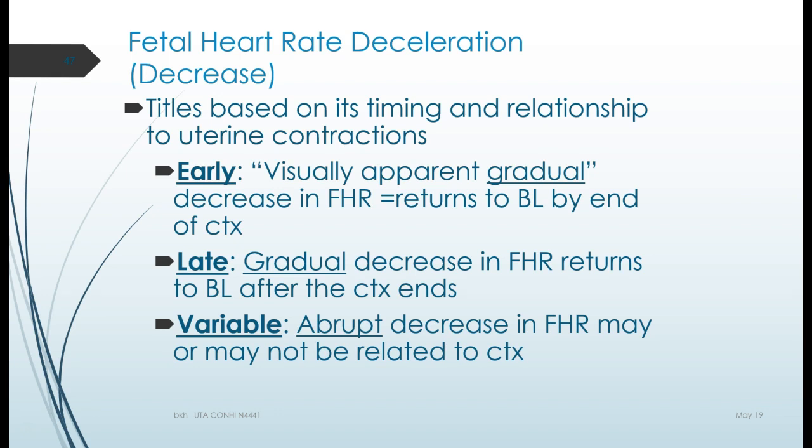And do you see, based on these definitions, why you can't have an early or a late without a contraction? You can have a decel, but you cannot have an early deceleration or a late deceleration if you don't have contractions, because it's based on the timing of the contraction.